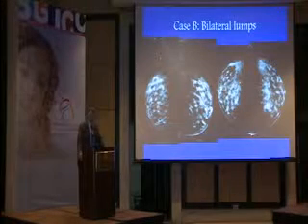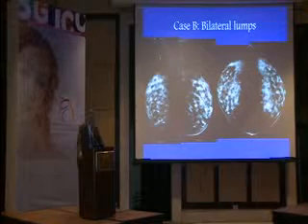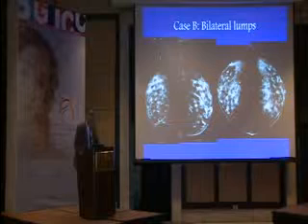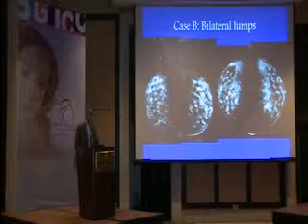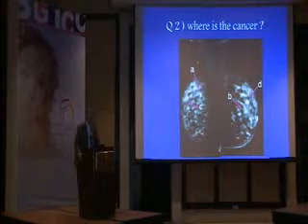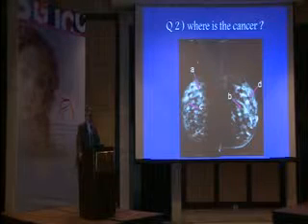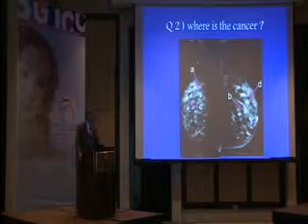Okay, second case again, but she has lumpy breasts, both sides. And in order just to see, again on the same basis like the first one, she has a cancer. So it's either A, B, C, and D, and I will leave this to you to vote for it, and you can start voting now.